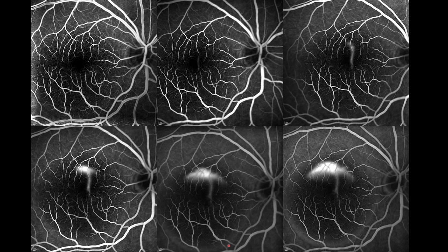Look at this margin and this margin, it is remaining the same. So in leak, as it increases, the hyperfluorescence is increasing, that is the white is increasing, as well as the area of spread is increasing. So this is leak, but this white area is pooling. So there is something here in which the dye is leaking and getting pooled. So the fluid is coming and getting localized or trapped in that area, something like that. I don't know how else to explain.